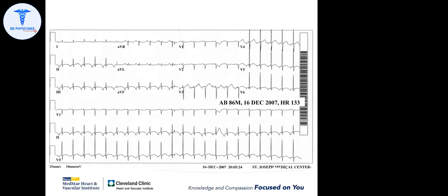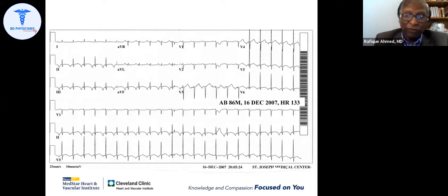Sir, this wave comes from the left side atrium. Exactly. So, left atrial tachycardia. Both of your diagnoses of junctional tachycardia are actually valid based on 2, 3, aVF. If V4, V5, V6 were positive, then I would have carried that diagnosis, but it is not. It is negative. So having V4, V5, V6 negative makes it a left atrial tachycardia.